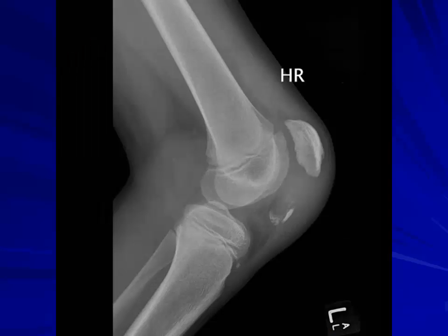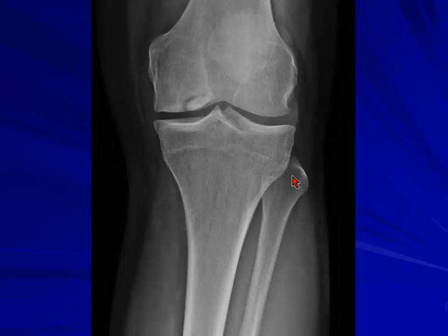And this one is, yeah, that's avulsion. So avulsion of what? Here or here? Yeah. So it's basically taken, and you've seen this is effusion. So you've lost planes and you've got effusion there. You can diagnose on plain film. What is this?